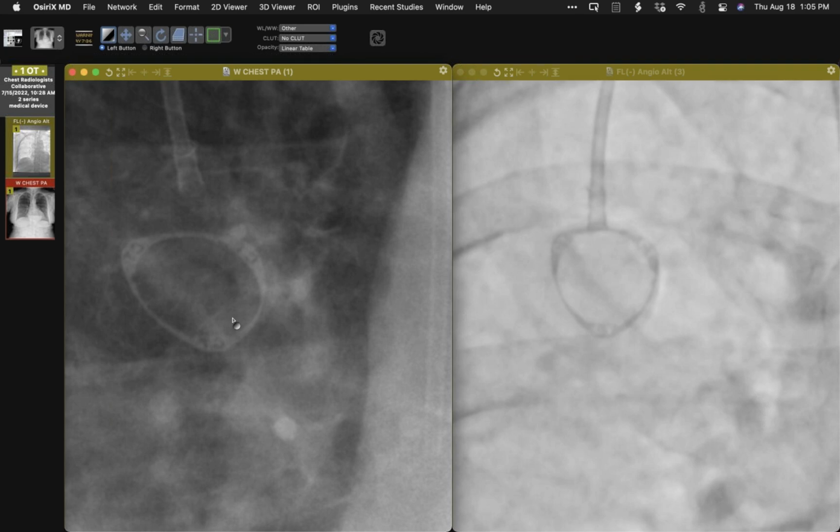So that's also an observation one can make to indicate that it's flipped completely around so that the needle accessible portion is now facing the chest wall, and no surprise that they were unable to presumably put a needle in there to actually use it. So in several ways one can judge that this has flipped, and it's flipped over completely by, say, 180 degrees, by looking at the CT and the CT back to front.